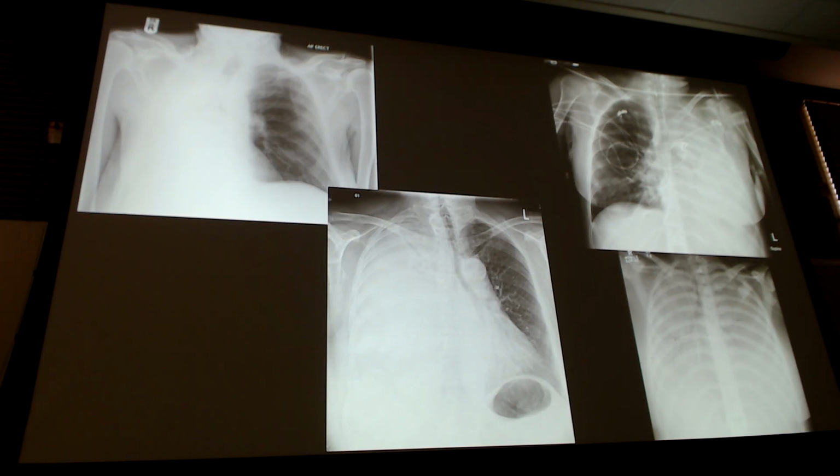Yeah, massive pleural effusion, right? Now I'm pushing this away over to the other side. What's the cause of it? Well, if there's trauma, I'll say trauma. But if there's not any trauma, I'm going to think probably cancer until proven otherwise. Okay? So good. Pushing it away.